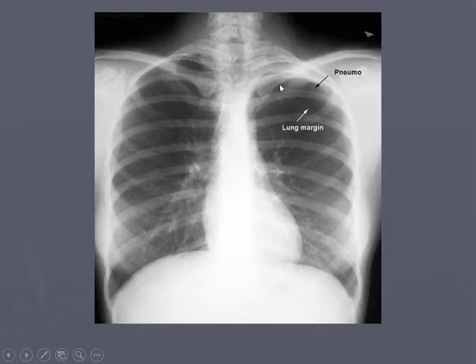All right, for diaphragms, I don't see any markers. I see a little EKG patch, nothing big there. And then the fields. Remember, black is air, light gray is tissue. Look right there, you can see this margin right along there. Look very closely, you'll see a difference in gradation. The lungs typically will have blood vessels in them, and it'll be slightly grayer than free air. So I would consider that to be a small to medium pneumothorax on the left.